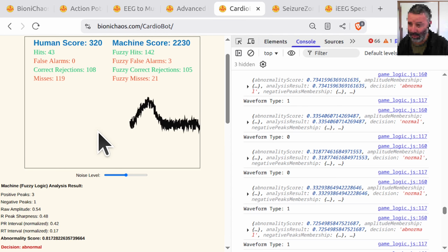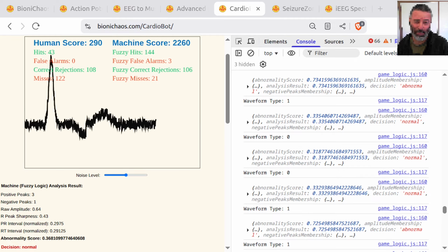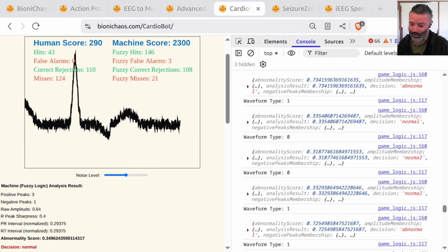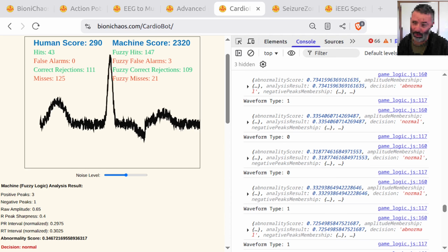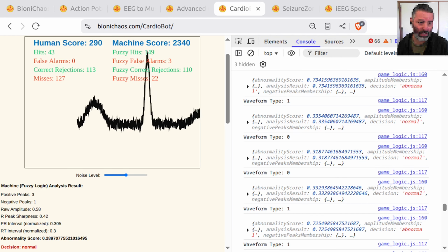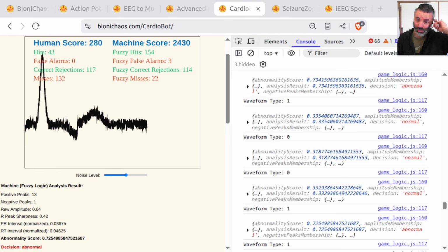Yeah, so I was saying this one has a backend. It's quite heavy on the backend actually. It has the ECG processing, about 100 lines of Python code, and it has a fuzzy analysis. This is where it's making the decision of normal or abnormal, and that's another 270 lines of code. The question is, and we made it quite some time ago, this is a Flask application.